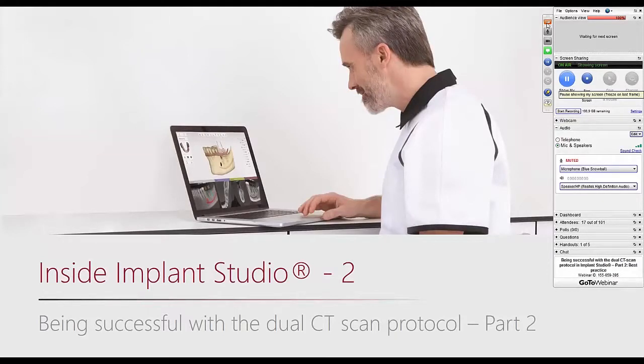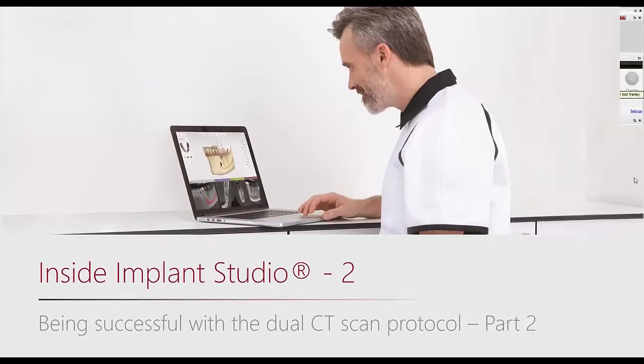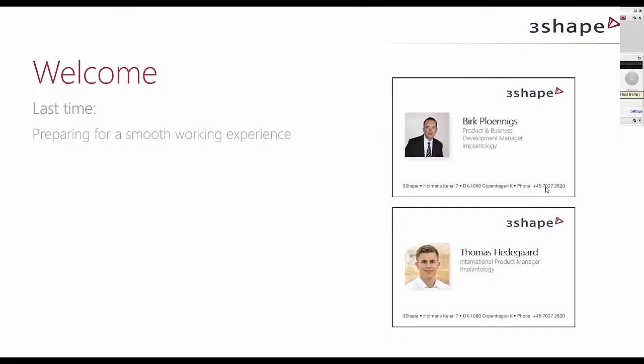Today again with Thomas and myself, we have clinics. We're going to continue on our presentation about how to run the dual scan protocol with Implant Studio. Last week we looked at the practical side on how to do it and how to prepare everything for taking the data into Implant Studio. Today we're actually going to look at how to do it inside Implant Studio.